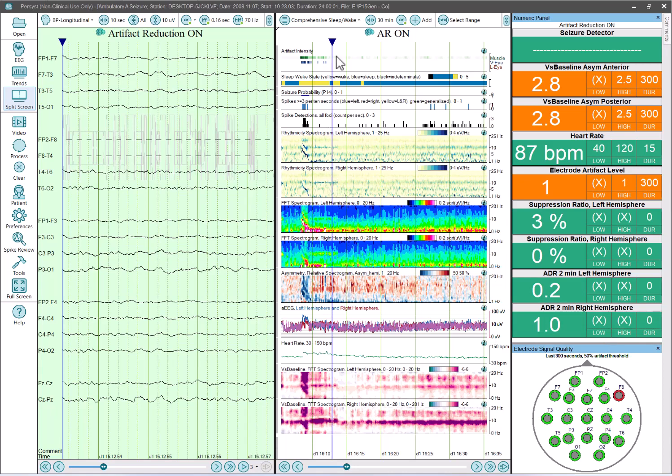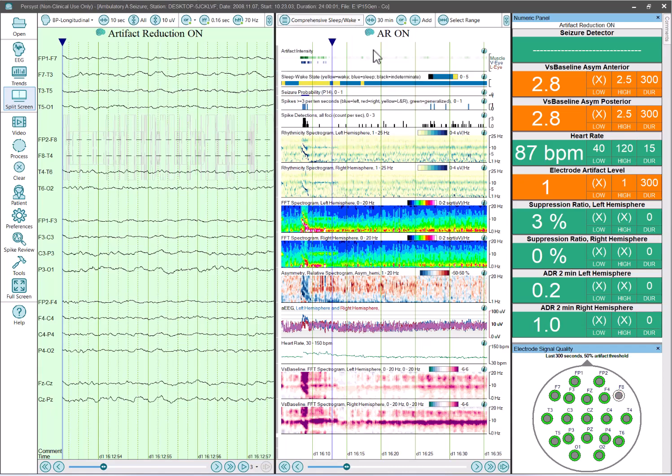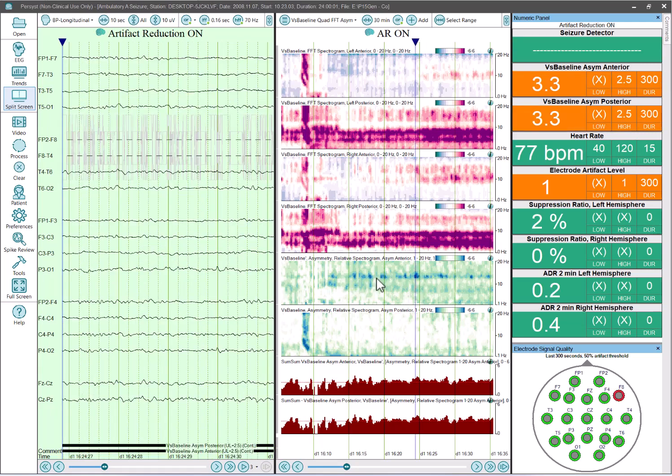Okay. So when we go back to that other trend, which is showing just versus baseline asymmetry, we can say, well, I want to know the statistical changes in symmetry going forward. And we can see there's a statistical change in symmetry showing up here. Well, how do we turn this into a single value? That shows up here.